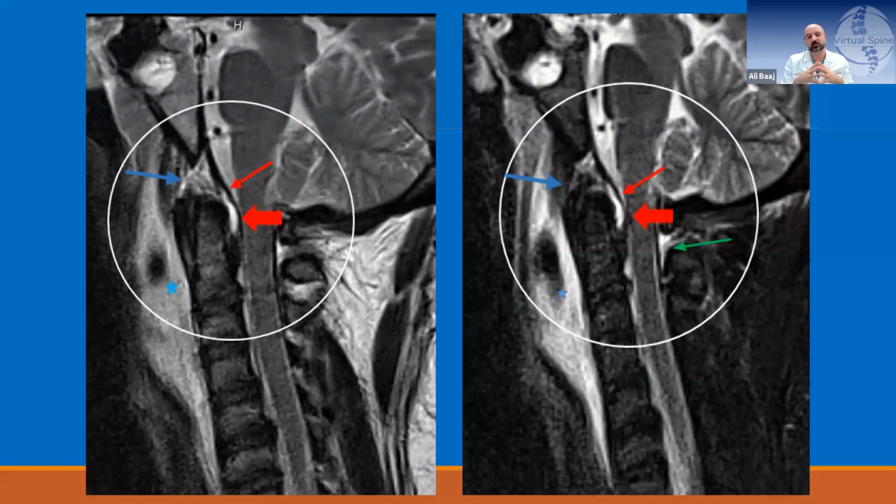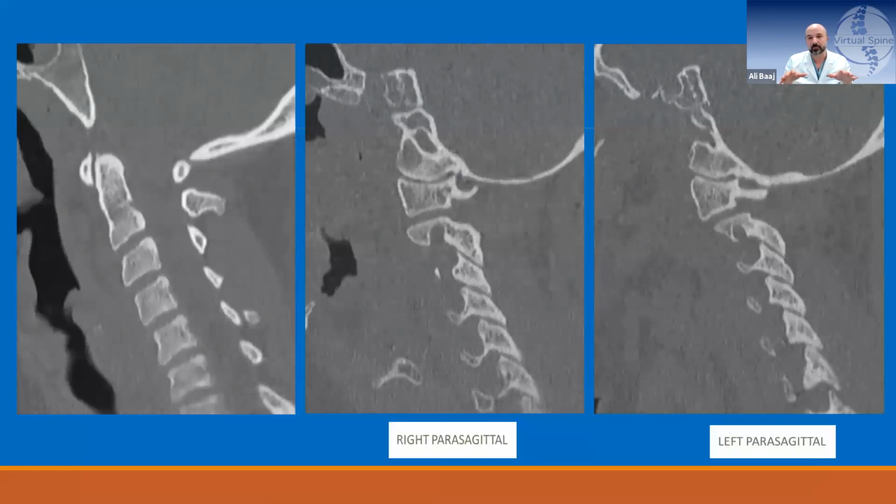I think this is a case in which, if I saw the CT and the patient's intact, 100% collar, no MRI. Okay. If I'm concerned about trauma and an increased basion-dens interval, if the patient has a lot of neck pain and then an MRI is obtained, then I would probably keep a little closer eye on him.